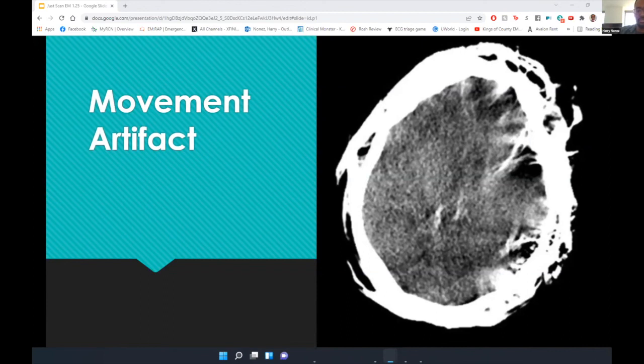This elderly patient came in for confusion and couldn't cooperate with instructions to keep still in the CT scan. So again, these images were taken while she was shaking her head in the CT. So the quality is non-diagnostic. You can't do anything with this. So they repeated the scan later, which showed no abnormality. The confusion was due to a UTI, hence her smelling of urine, just being incontinent. So this is most likely the most common cause of confusion that you'll see in elderly patients.